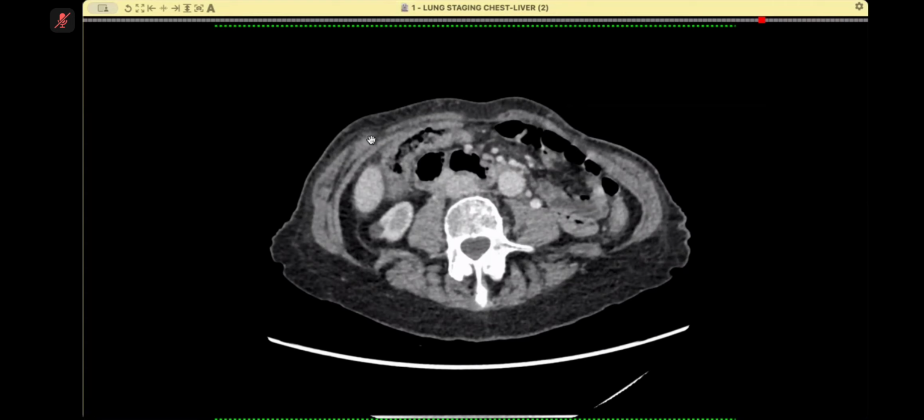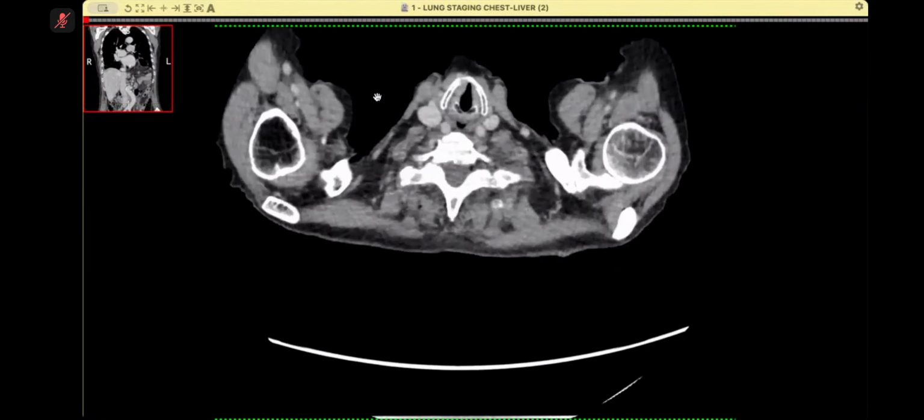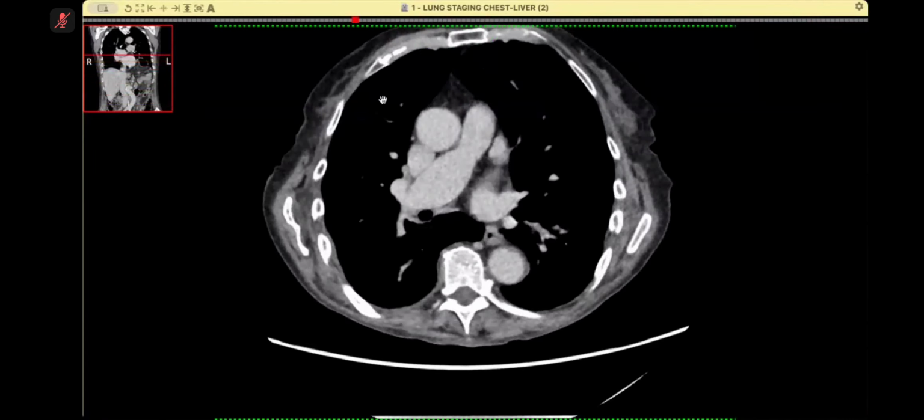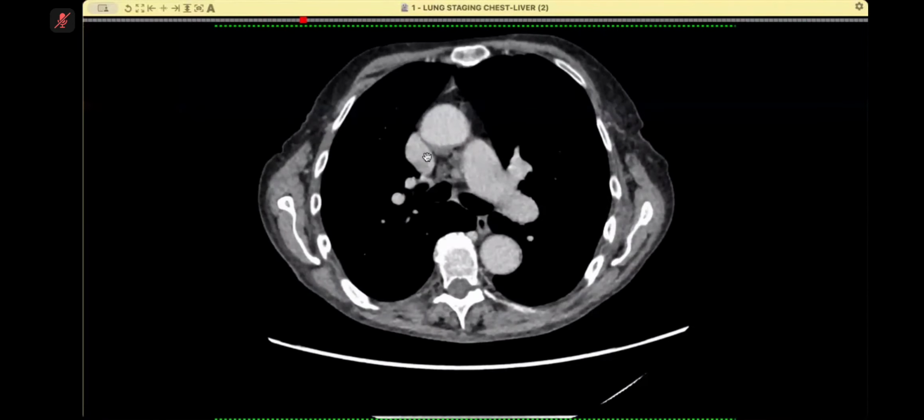Since then, having fever off and on, and now has developed right chest pain and fever. X-ray was done. There was effusion on the right side. With that, the respiratory consultants have asked for a CT. So I'm showing you a CT. Over to you.